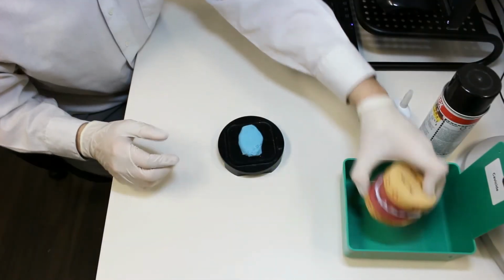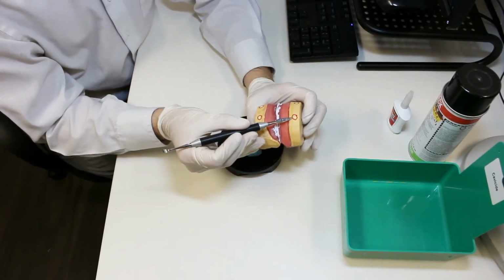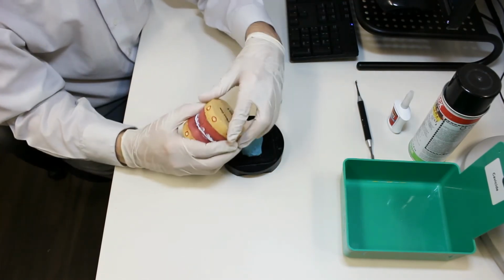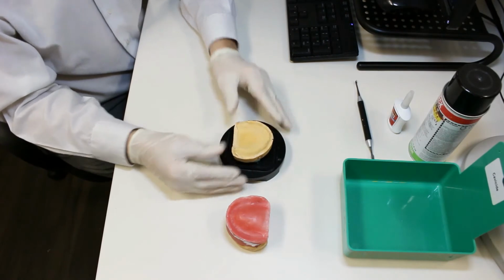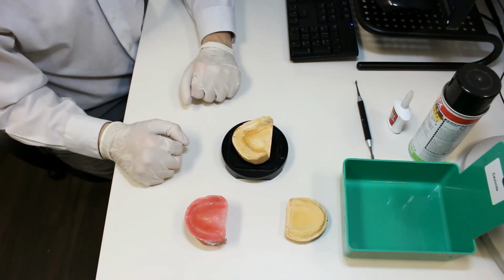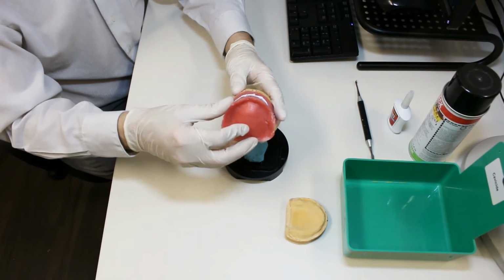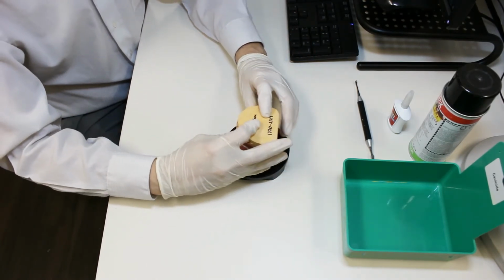Set your cases in the plate with putty. For wax rims, you will need to drill 4 holes per stone model for software alignment. The upper stone model position would just be facing up at 0 degrees. The lower stone model position will be facing up at 0 degrees as well. For the bite scan, please attach the wax rims back into the stone models and put them facing yourself.